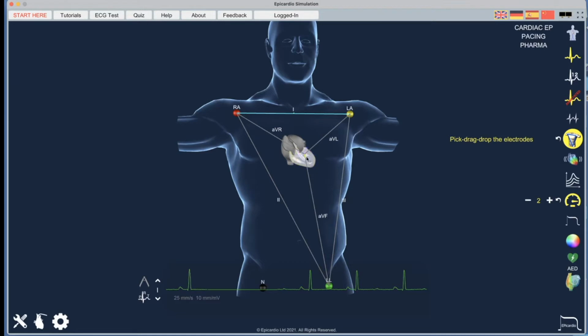I will see a yellow vector in the middle of the heart. You see? So this yellow vector represents the electric heart vector. It's the average electrical activity flowing through the heart. It's the average action potential, which is given as a vector because it has a direction and it has a magnitude. Now that vector is projected along the lead 1 to generate the ECG over time. You see that little yellow line going positive, negative on lead 1.